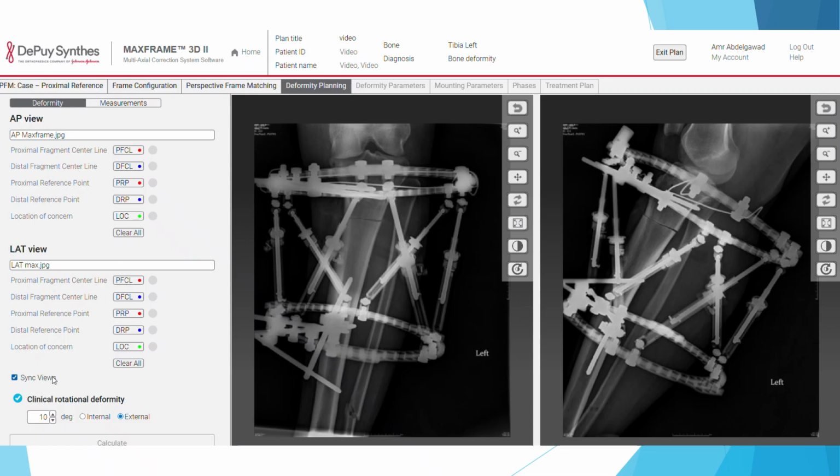That's not very important. The difference is very minimal. Let's talk about the proximal and the distal reference point, and what is the difference if you pick them at a different level. Some of this information will depend on some of the osteotomy rules that I'm going to put in the next slide, so you understand the basics of it.